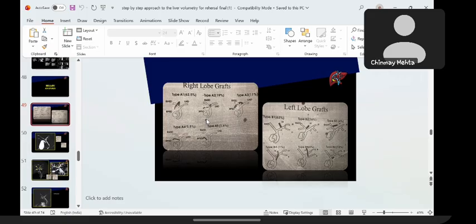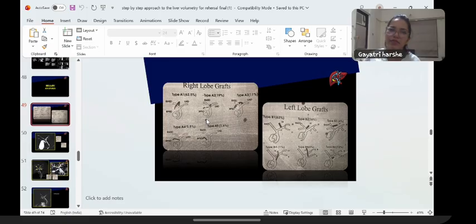I wish they had clarified it further, but okay, if it is a segment 4 artery arising from the right hepatic artery, that will not change the plan, but the length of the right hepatic artery after the origin of the segment 4 artery is the deciding factor.